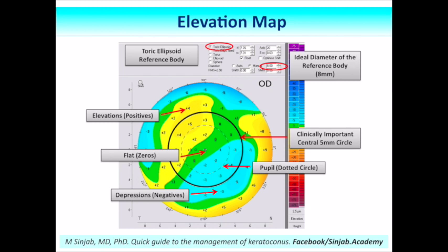And finally, the flat areas take zero values and they are in touch with the reference surface.